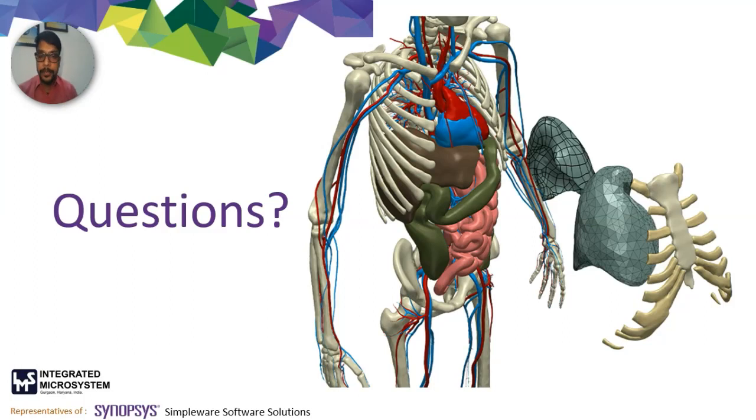And similarly, the same process is for the knee segmentation. So if you are working in batches of knee images, you can utilize those modules for doing automated segmentations by just importing the data and doing the segmentation completely automatically, and later on exporting it for 3D printing purposes or simulation purposes or surgical planning purposes.